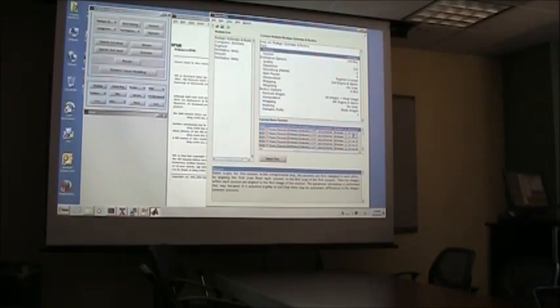A similar file to yours will have a comma after the file name, and then an index for which volume it is. So you set something like this up, say with 4 runs. SPM calls what other people call runs sessions. That doesn't really matter, but you set up 4 sessions.